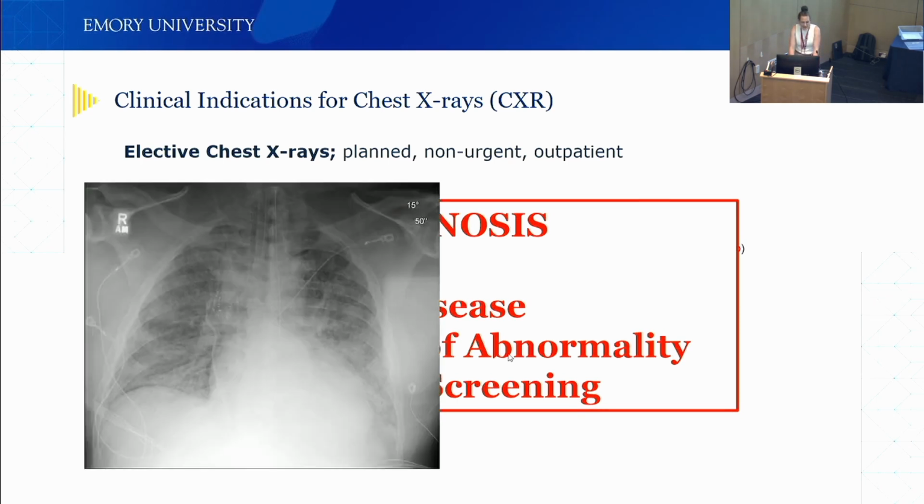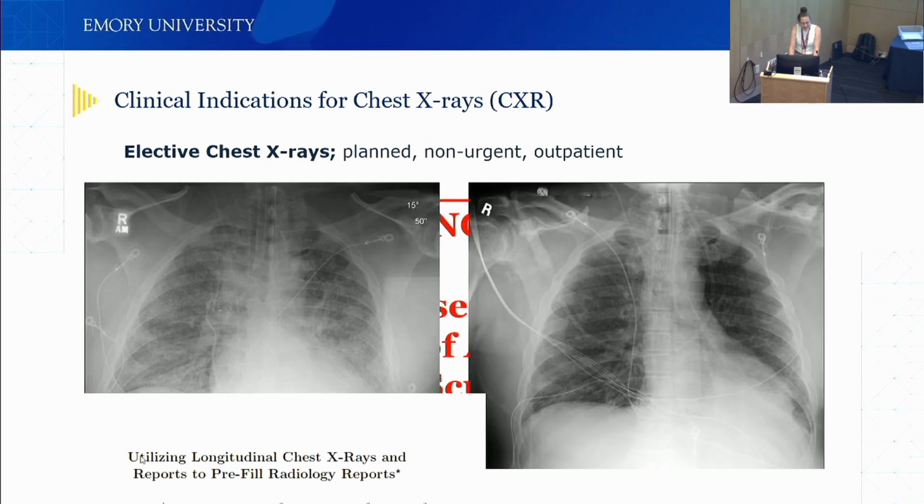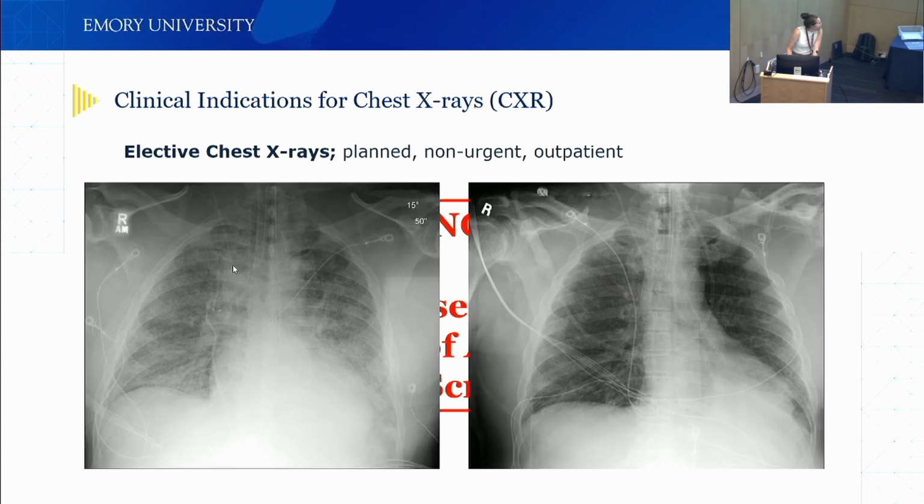This is a normal x-ray. This is another normal x-ray. So they're not normal, but this is definitely, the left one is not a normal x-ray. They're from the same patient. They are taken 3 months apart.